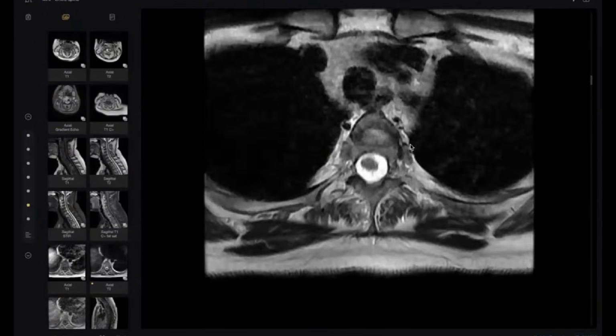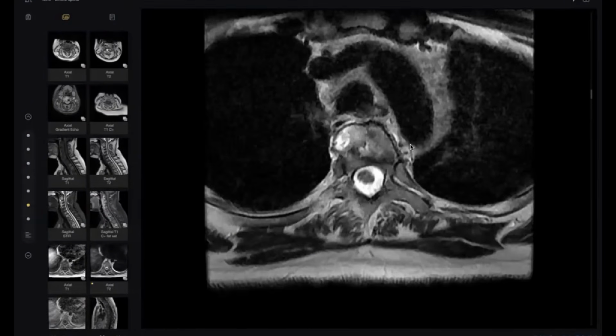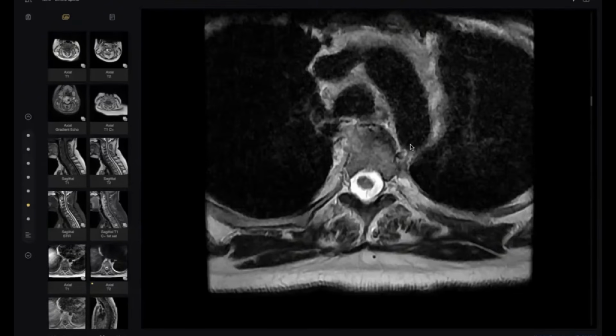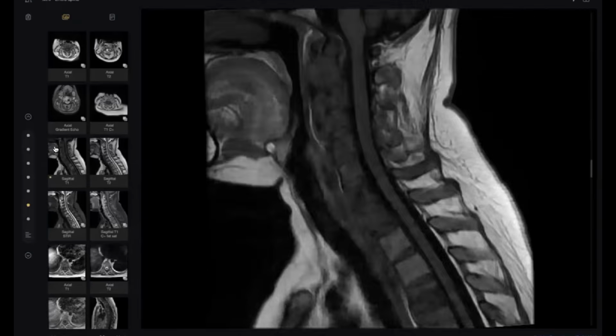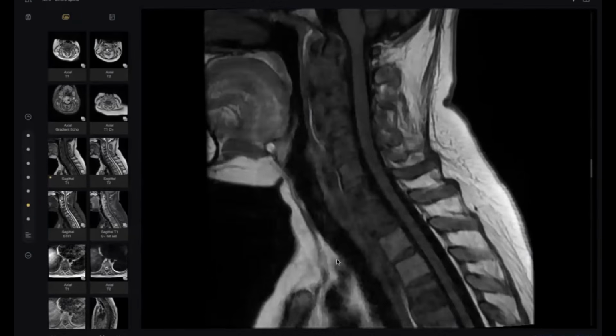So the lung looks infected, and this is a very, very great proof of a multisystemic TB, because almost always the TB will start as a pulmonary TB, and then it will be disseminated hematogenously to be multisystemic like this in the spine or whatever else in the genitourinary system. Genitourinary system is very, very common.